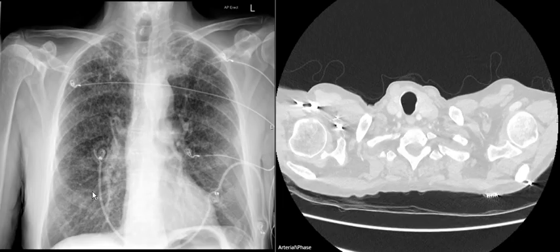But in the general sense, his lungs look a little bit long, and we'll count ribs posteriorly. So that's the first rib at the back where the transverse process is, and at the front. So that's 1, 2, 3, 4, 5, 6, 7. They're starting to get a bit hazy. I'm going to go 8, T9, 10's about there. You can see it on that side. And then that's the 11th rib.